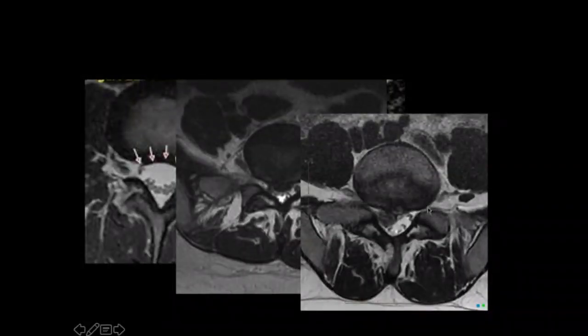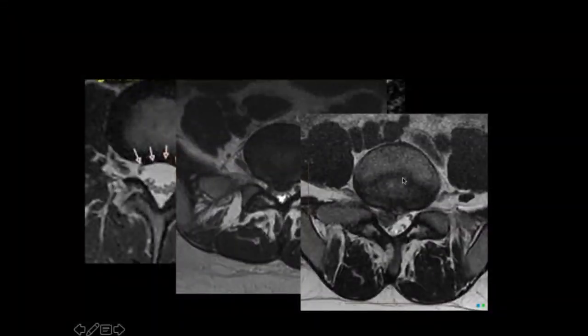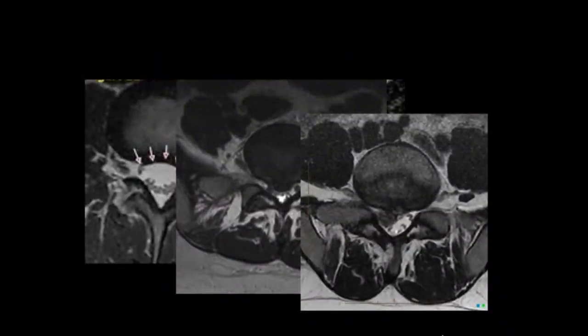So this nerve would exit the intervertebral foramen and lower down. So this is the traversing nerve. Then you go to extrusion, which is the nerve getting pinched by this material, which looks like disc material. So you can see that the intensity is almost the same as the disc, and it's extruded out where the depth is more than the width. So that's the extrusion, and then eventually it might just get detached from the parent disc and lead to sequestration.